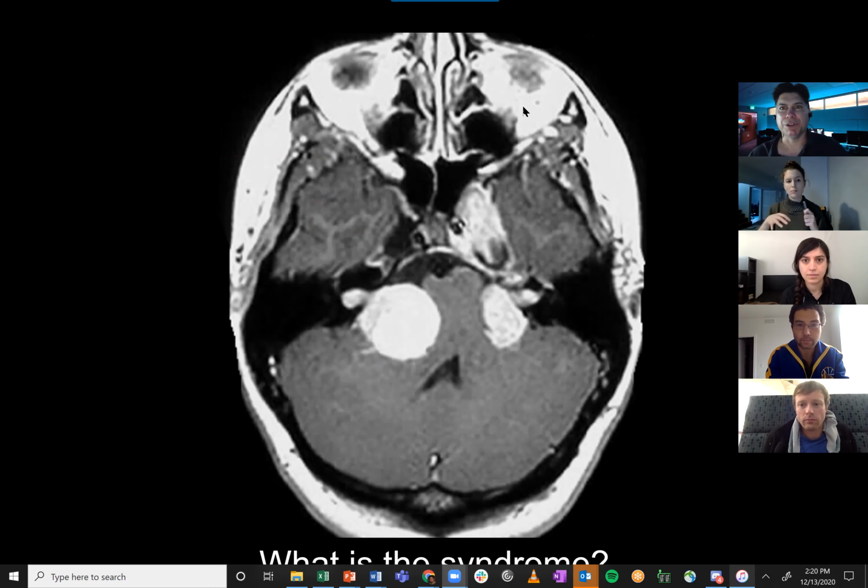So MISME syndrome, and there's another lesion there. It looks like in the cavernous sinus or middle ear. So we call it NF2, but it's really better termed MISME syndrome, multiple inherited schwannomas, meningiomas, and ependymomas. That's right. Good job. Okay, next case.